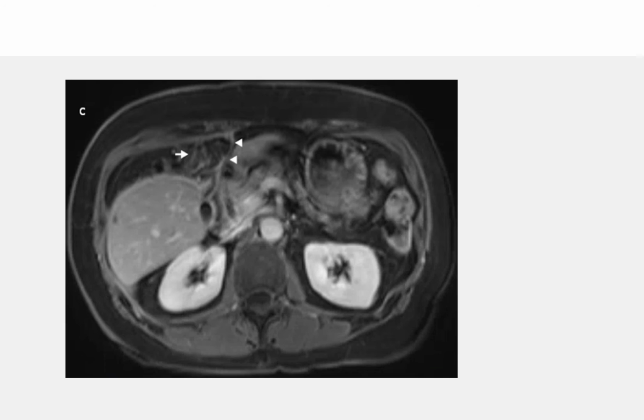Here we can also see the encapsulation of that area of necrosis because there's this rim enhancing area and involution of the fat there. And so this corresponded well with our initial findings of focal infarction of the falciform ligament and the sequelae or natural history of this process.